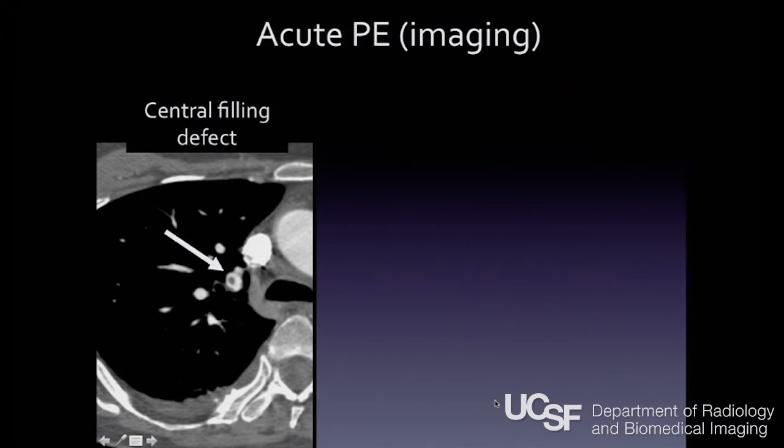Okay, and now we're going to finish our whirlwind tour with pulmonary embolism imaging, which we do every day. I'm going to try to emphasize a few of the controversies and what your approach should be and how you should read these. Unfortunately, radiologists do not have very good interobserver agreement for small vessels. So I'm going to try to get everyone on the same page as to how we read them, and then you can make up your decision on how you read them as well.